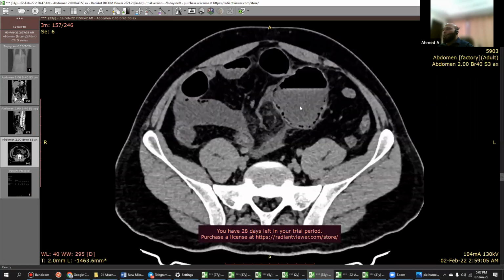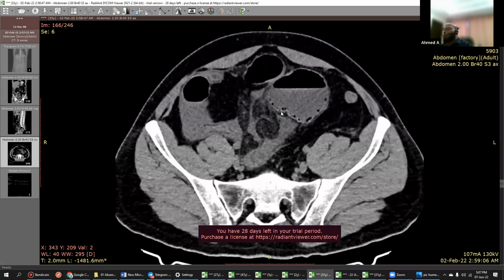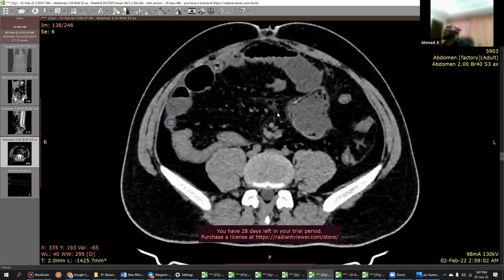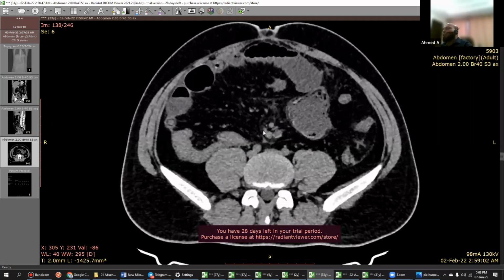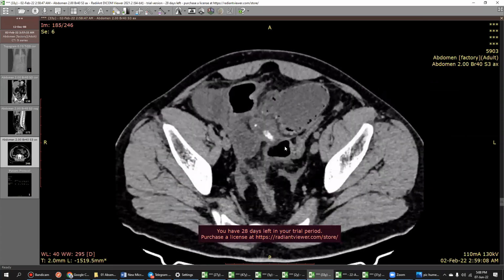The criterion for malrotation is that it will be more anterior. The SMV will be more anterior and all. It's an incomplete rather than a complete reversal. Rather than complete reversal, it will be in the midline.